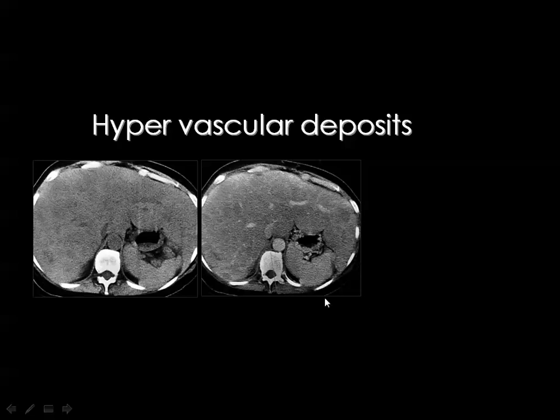Then we performed this technique for some time, a pre-contrast scan and a post-contrast scan. You see the liver is enlarged, and you may identify some of the focal lesions inside the liver.